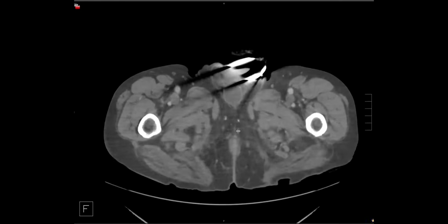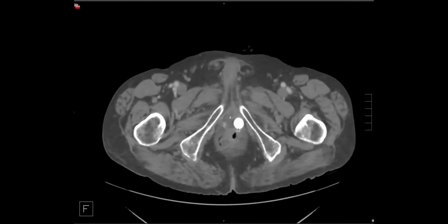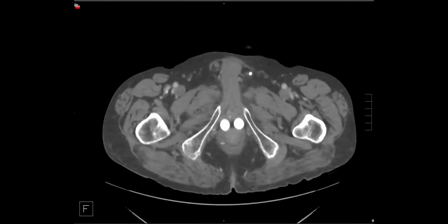In one image, it's like a smiley face. Where's the smiley face? Oh, there it is. Elmo. I see Elmo, and that's exactly what I see. I have so much Elmo going on in my house that I didn't know if I was too biased. But yes, I see Elmo. This is an Elmo sign.